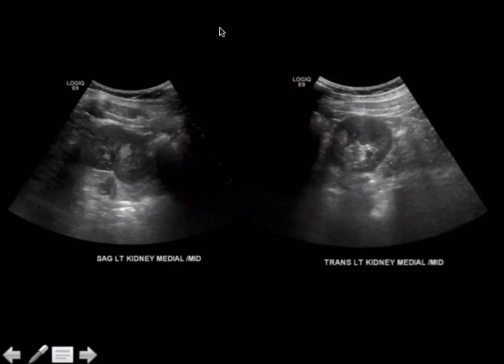Okay. All right, here we go. Ultrasound renal cases. For the purpose of gamesmanship, this is how I like to address single cut ultrasound kidney pictures through the kidneys. If they show me a left kidney, I think that it's probably going to be a focal lesion. If they show me a right kidney, I think it's about echogenicity questions, and here's why. Because if you show me the right kidney, you're also showing me the liver.